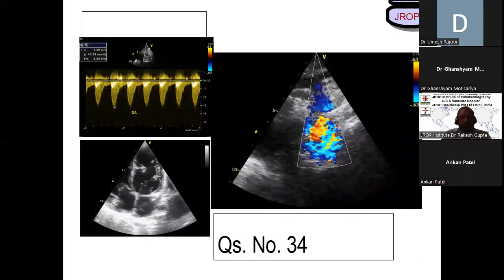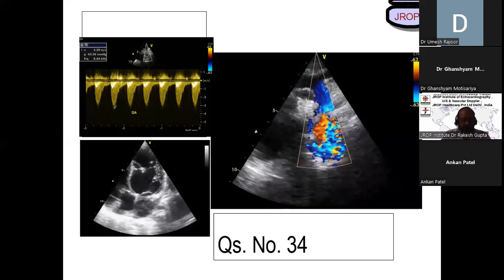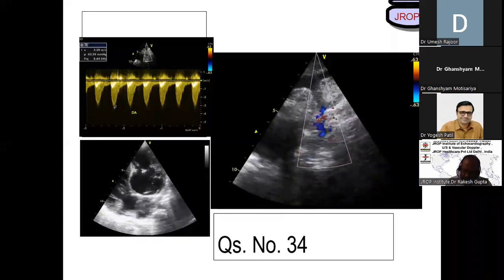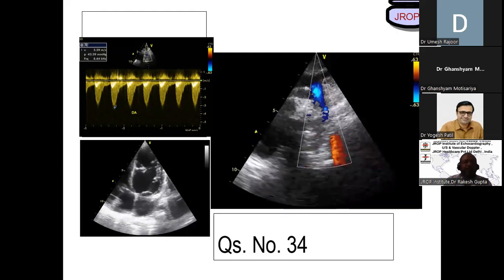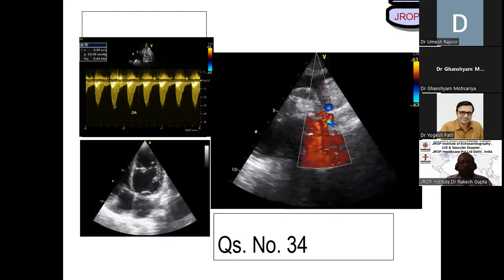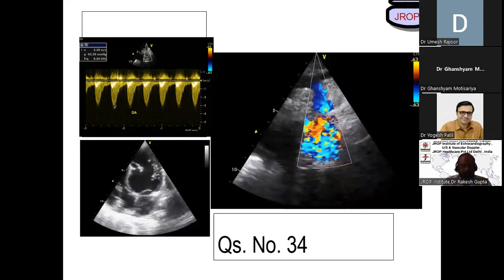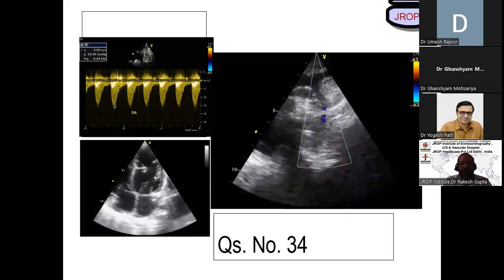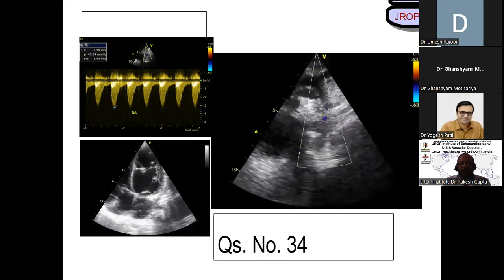Okay, no, it's wrong. Dr. Ghansham, is this coarctation of aorta? Perfect, it is coarctation of aorta. Good. What else in coarctation of aorta? What's the gradient on the left-hand side? 43. So you want to comment along with all these 3 pictures, Ghansham? Improve your marks. Pardon me, what did you say? If you put all these 3 pictures together, do you want to comment something?